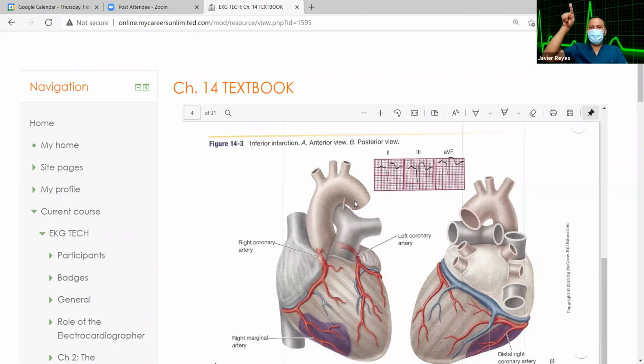Because it's together with a T wave. It looks like a big square, right? Do you see that? So the R wave was not even able to come down a little bit. As soon as it was going to come down, it went this way and it got together with a T wave. So that's what you're looking at.